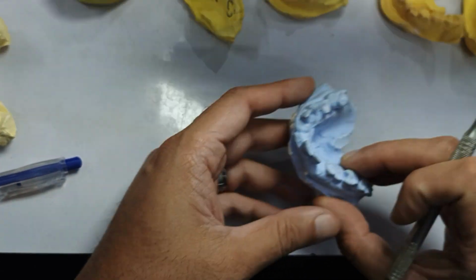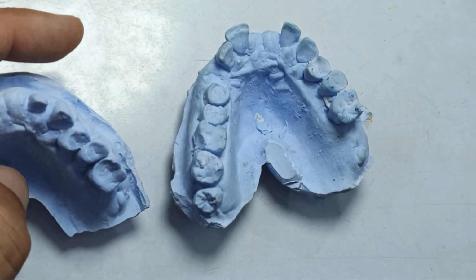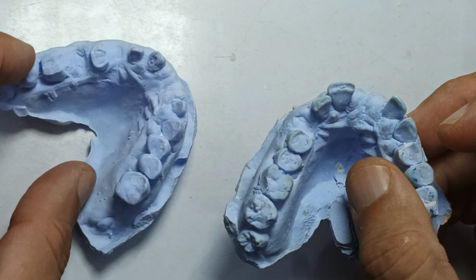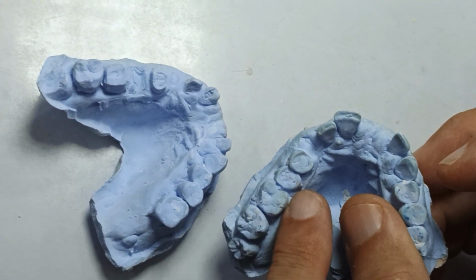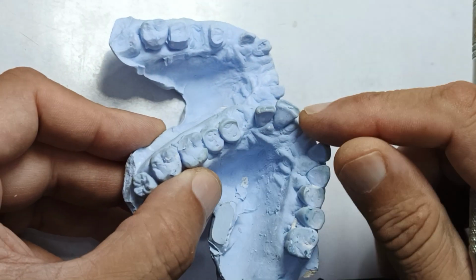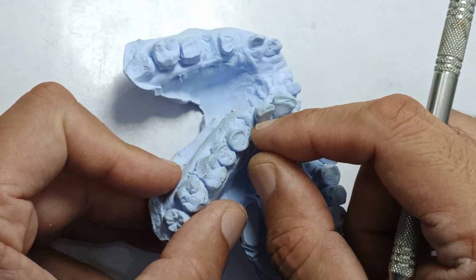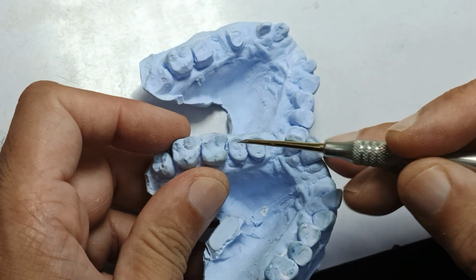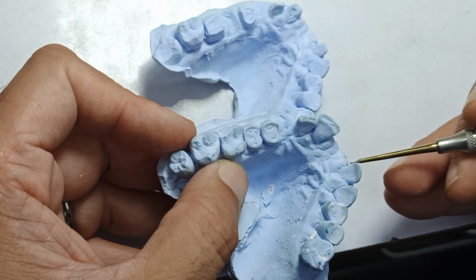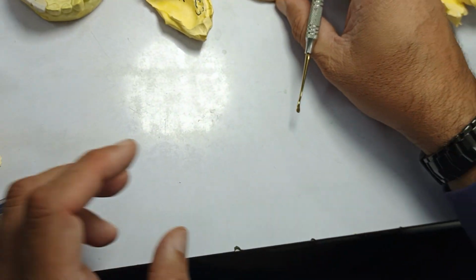Here we have another one. Look at this. This is how the teeth were before. And now it is after right here. Look at this. What have they done? And extracted this tooth out. I don't know why. And look at this tooth. It's cut right there. Now in this case, why won't you give a partial? Or if you're doing a bridge on these two, and maybe with a pontic as a cantilever. This tooth did not need to be crowned. All it needed was a filling. And look at these two good teeth. This is so horrible. You could give a Maryland bridge right there. So this is a horrible example. Let's come to the next one.